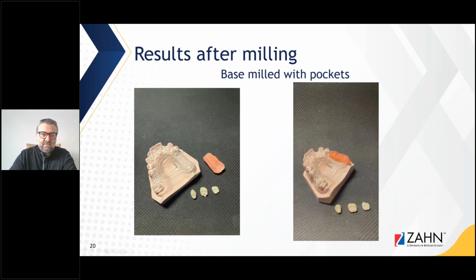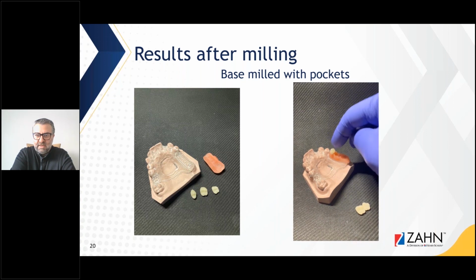So it comes in different packaging, obviously, for those of you who are very familiar with denture teeth. And then I made a quick video to show you how, and by the way, there's no actual luting agent at all at this point. I have just used my basic default parameters for this design, and this is the result that you're going to see. So just take that tooth and drop it in. Take the other one, drop it in, and it fits like a glove.